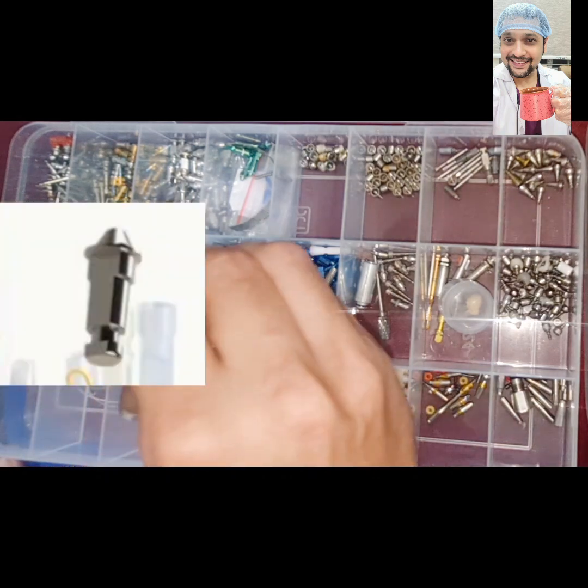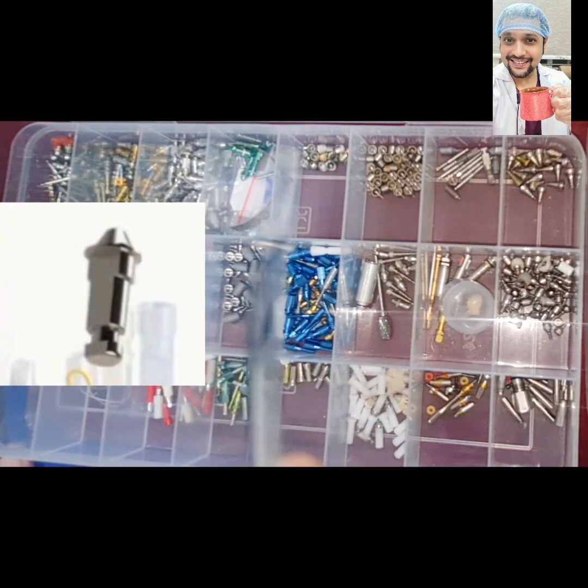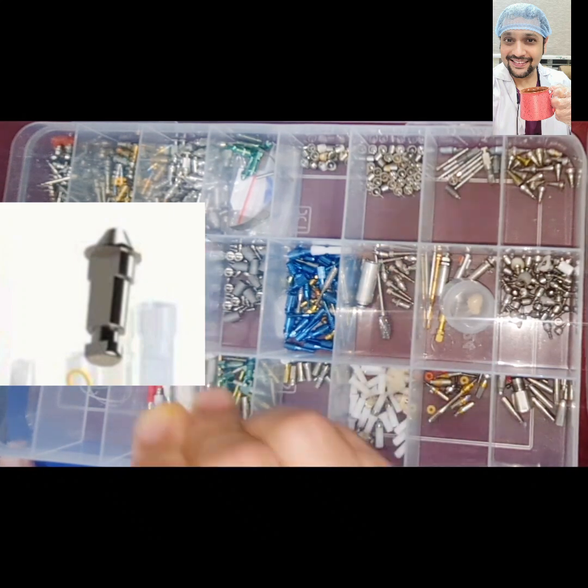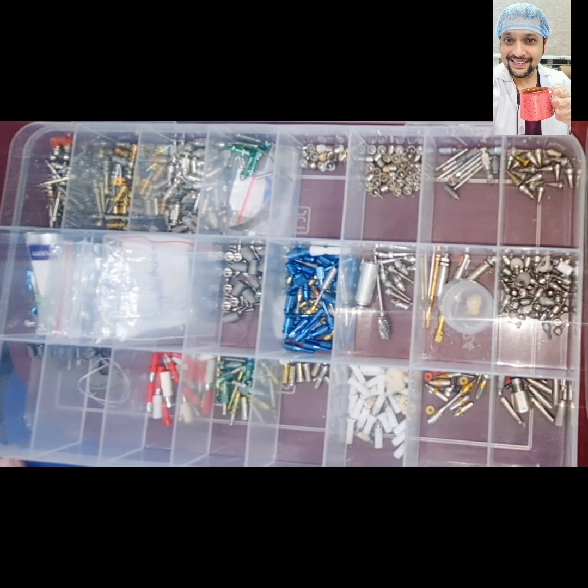The analogs for MUA are different. If you see here, these are the analogs. Similarly, you will get digital analogs for the MUA level. Every component, when it comes to the MUA level, is different now. It is not something which goes and fits into the implant level now. So you should have two now, one implant level and one MUA level armamentarium in your implant practice.